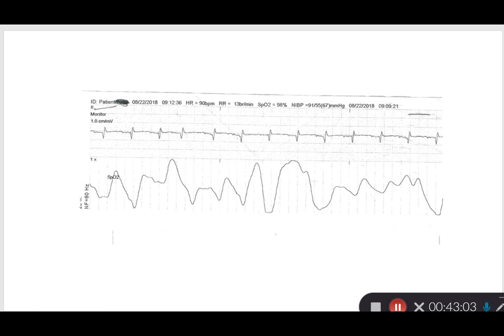All right, this one is kind of difficult to see because it's kind of small. We do have a heart rate up here, it's 90 beats per minute. We can see our QRSs, they look narrow. Just by looking at it, I know we can't see our blocks. And then here are my P waves. So that's kind of hard to pick out at first. So you notice that the P waves are inverted. But another thing that we can notice about these P waves, even though we can't measure out blocks, we can see that my PR interval is very long. Just looking at it, I can tell that it's over 5 blocks because it looks irregularly long.